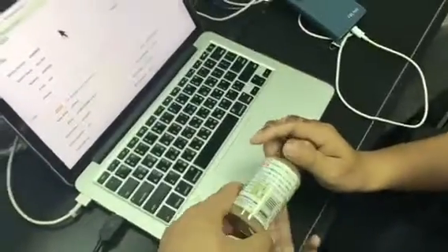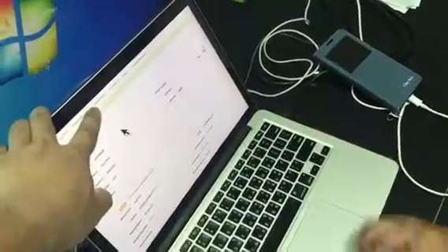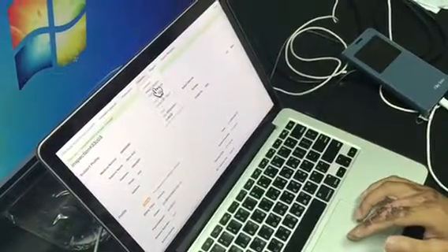Up here is the profile, and down here is the tube information, and further down you will see what kind of test you need to do. Okay, then we start to do the processing, right? Suppose this tube now we'll send to the lab and prepare for processing. So we need to tick this one to make a check-in for this tube.